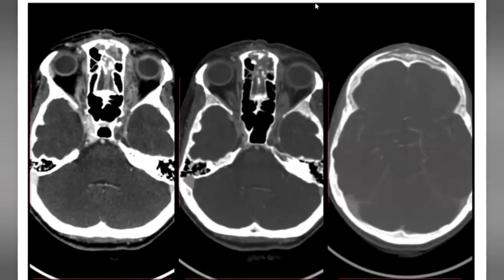It is sinusitis along with intraorbital extension and cavernous sinus thrombosis as well. Yes, exactly. So this is left cavernous sinus thrombosis, and this is a fungal infection which is everywhere within the orbits. It's breaking up all the bones, causing osteomyelitis. So this is extending into the cavernous sinus. This is the non-enhancing left cavernous sinus. Here you can see the artery and the sinus itself. Here there's another finding, that you can't really see the artery as well.